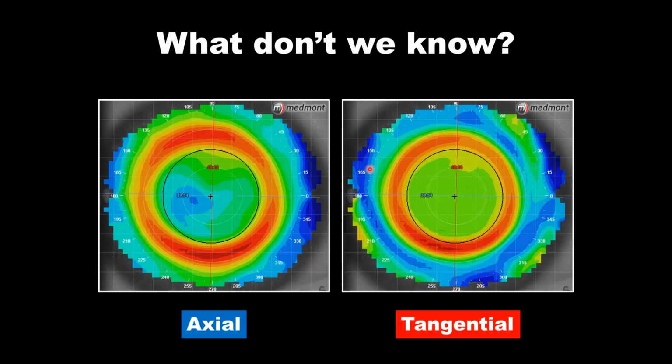Well, part of the problem is that we are using an axial post-treatment and a tangential post-treatment. And we don't know the full story. We don't know what refractive change we created. We don't know what the treatment zone size was. We don't know what the absolute position of the lens was in the closed eye environment. All of these things we learn from something called a subtractive map.